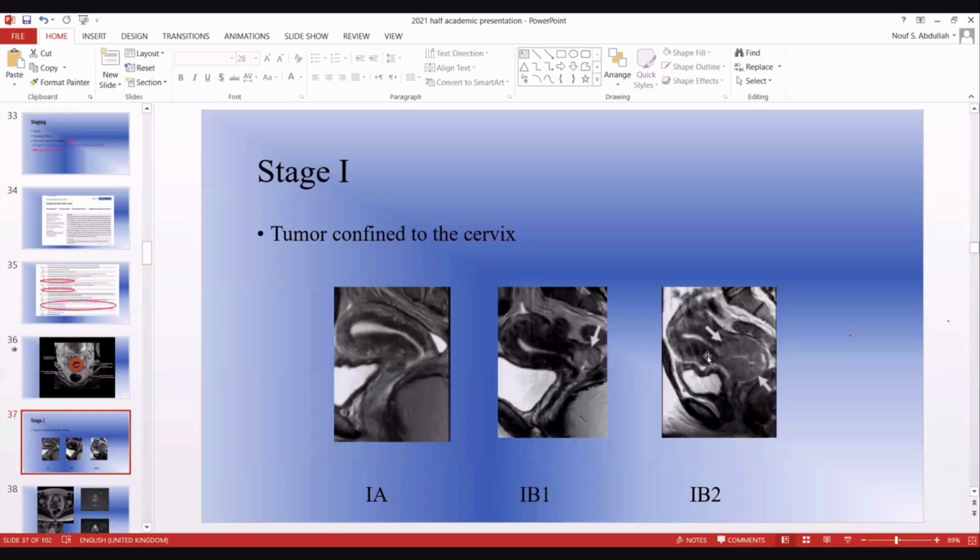So obviously, I have to look, you have an enlarged uterus and you have a mass. What is the epicenter of the lesion? You remember the first step we said we decide, is it uterine versus extrauterine? So I know it is uterine. Now your next question, is it uterine or cervical? The epicenter of the lesion is really within the cervix.